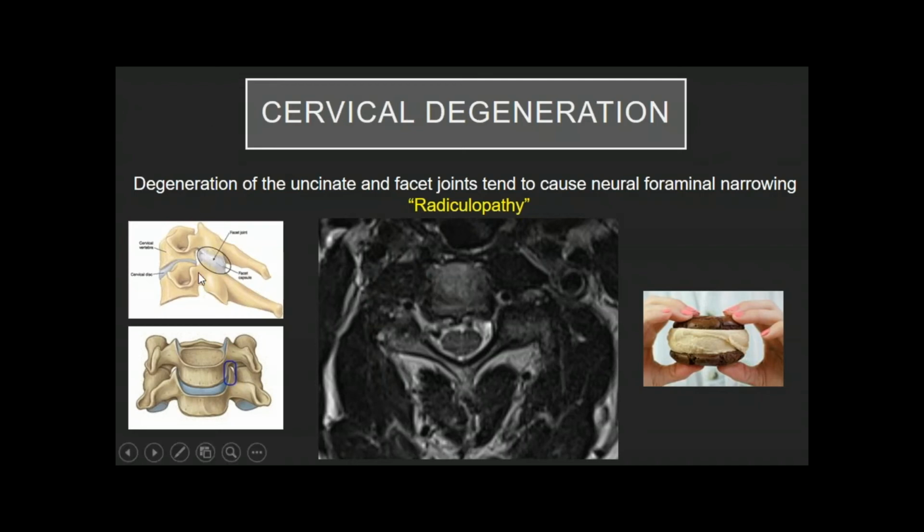So I've talked about these quite a bit, but here we have the facet joint. Here we have the uncovertebral joint, which you got to see nice pictures of on that prior radiograph. So what do they do? This is an overgrown uncovertebral joint. This is a T2 sequence. The bones look quite dark on a T2 sequence. Well, on this one, the fat can be bright. Anyway, I'm not going to go into MRI physics land for you guys, but essentially, overgrown sclerotic bone is going to be dark on T2.